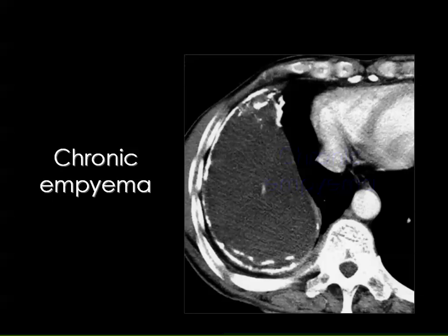And I also projected this case before, where you see an empyema with extensive calcification of the pleural surface along the margin of the empyema, suggestive of tuberculous etiology.